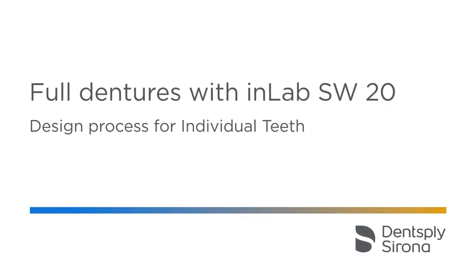Welcome to this video tutorial on full dentures with inLab Software 20, design with individual teeth. In this video, we show how to design, finalize, and export a digital full denture.